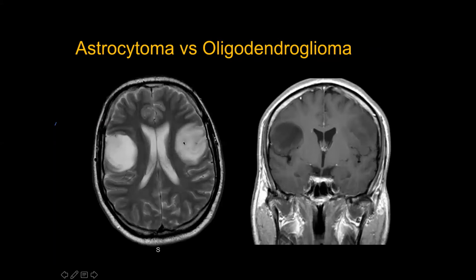So this is one you don't want to take out. So we proceeded to biopsy this, and this one turned out to be astro, and this one turned out to be oligo. And they treated with chemotherapy. This one shrank away. This one shrank a little bit, but eventually, whatever was left turned to GBM. The patient died from it.